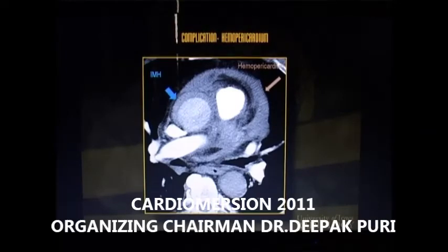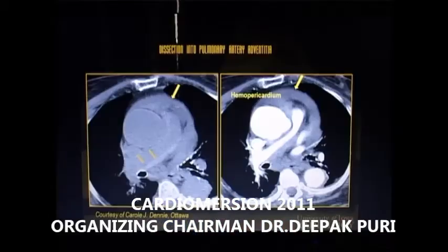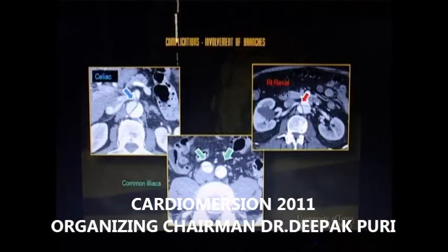And this is another very nice example, which was given to me by one of my friends, where you can see this hyperdensity which is extending into the pulmonary artery. So basically, this is the hematoma which has extended into the adventitia of the pulmonary artery, and as you can see, it is being compressed, and you can see the hemopericardium. This entity does not have a very good prognosis.